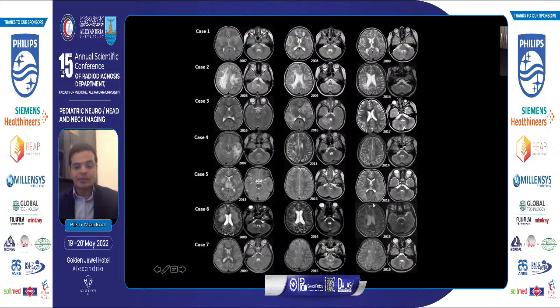In fact, if I just gave you this case, you would probably start thinking about adrenoleukodystrophy. This is a leukodystrophy type of presentation. This is typical of MOG. MOG can also give you confluent white matter changes like that at presentation. It can also present with frank encephalitis. So have a low threshold to screen for MOG.